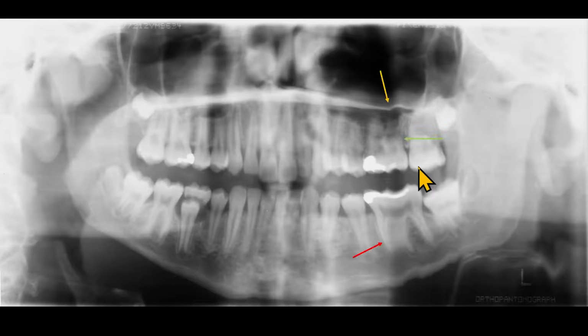We see a step defect in the area of the motion of the hard palate. So all these line up at the same location. Look at the inferior border of the mandible, and here is a step defect. So somewhere in this area, the patient moved. So when the exposure is going on, this is the time the patient moved. So the motion is recorded in the same location. In other areas, there is no motion. Also, we see that the hyoid has moved on the left side, not on the right.